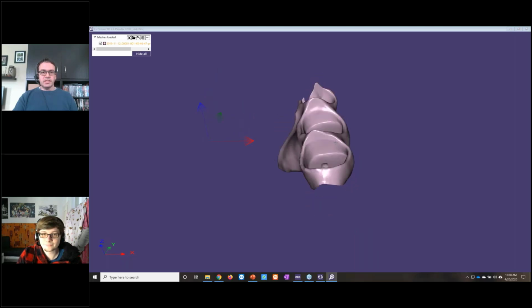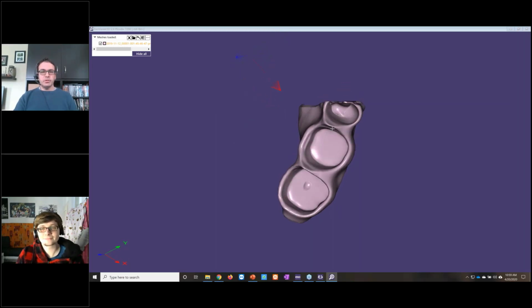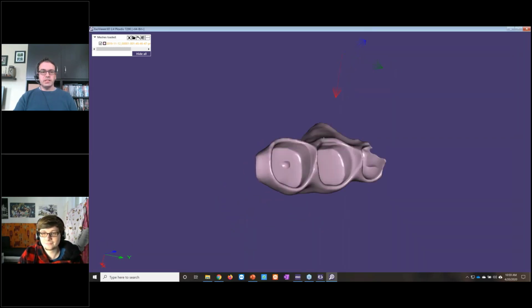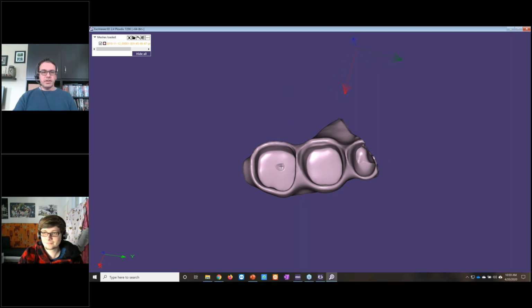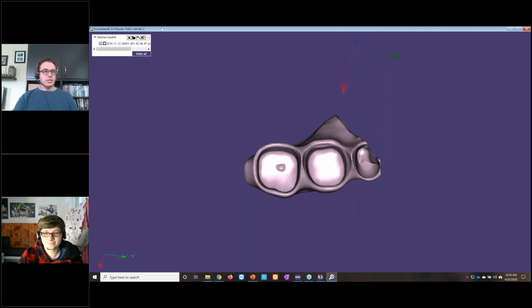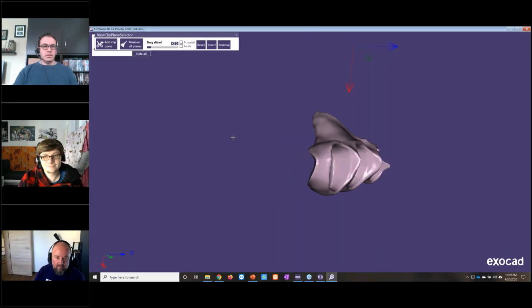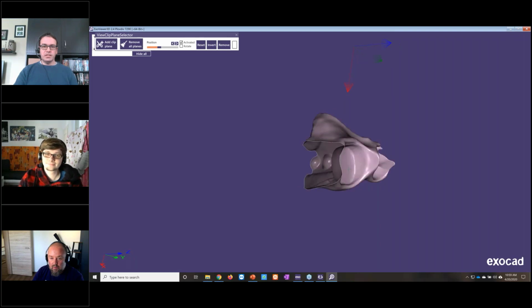So top side, for example, these are the tooth pockets that were calculated, and the minimum thickness that we specified at 0.4 millimeters, what the software does is make sure that this material is about 0.4 millimeters thick over our framework file. And then any areas where that framework would stick into the tooth pockets there, it's been adapted to that. Let me try a cutaway here. Yeah, we can see that shape as it goes over the dimples or retention areas in the partial framework. So this gingiva actually kind of dips down in those areas.